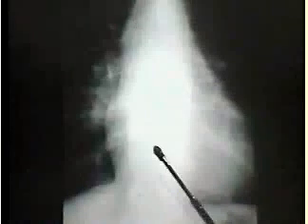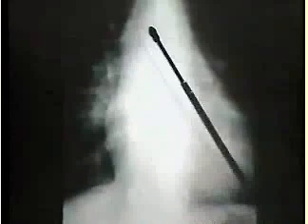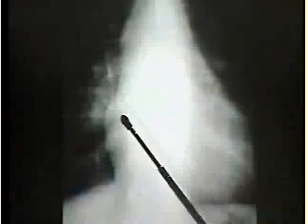Well, here's a chest film. Can you see on this chest film the aerated lung coming over to the esophagus in this inferior portion of the azygoesophageal recess, but instead of continuing all the way up to this level, that line is displaced outwards and around this mass shadow, a huge subcarinal mass. Notice that it is not border forming with respect to the mediastinum, except on a well-penetrated film where one can appreciate a little bit of this outline. That is a very large mass.